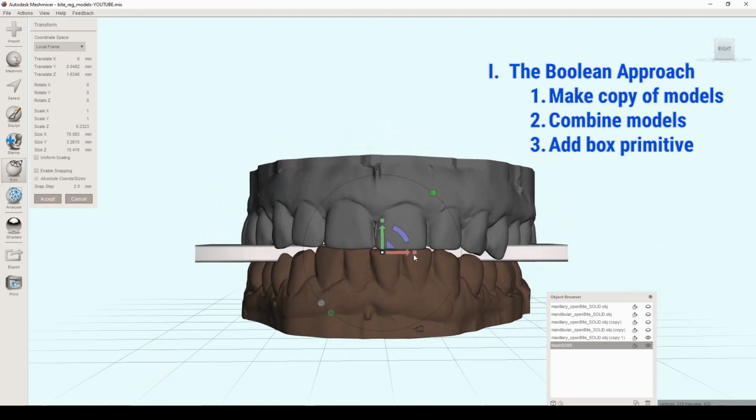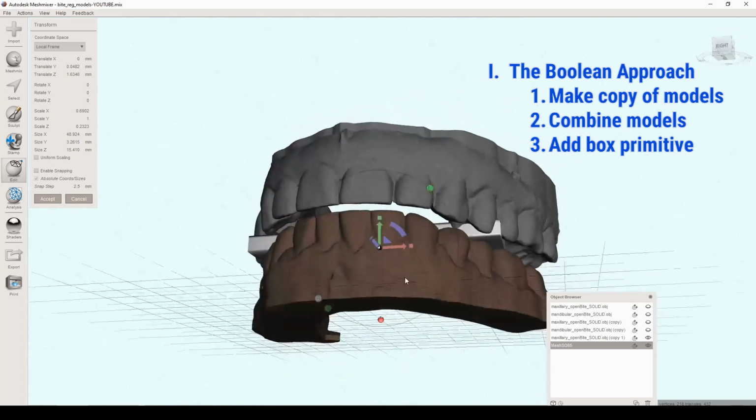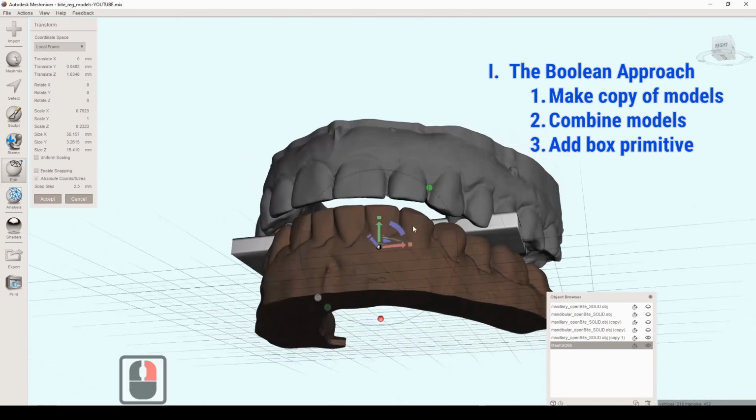I'm going to shorten this as well in this direction because I don't need any of that. I really don't need too much of the outside cusps either, but I'm going to put it just midway through. So right there, I could do it just a little bit more for example purposes. Go a little bit out. Okay, so that's fine. Everything looks good there.